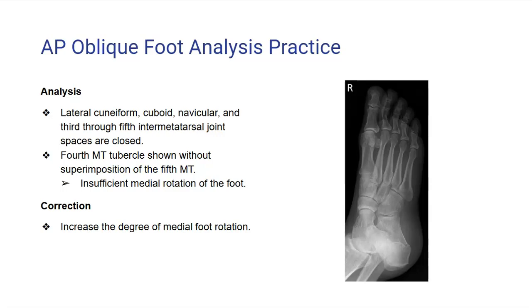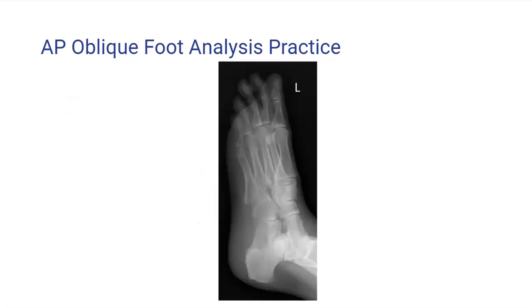In order to correct this positioning error, you want to increase the degree of medial foot rotation until the required joint spaces are demonstrated as open. Go ahead and review this next practice analysis and answer the following question.